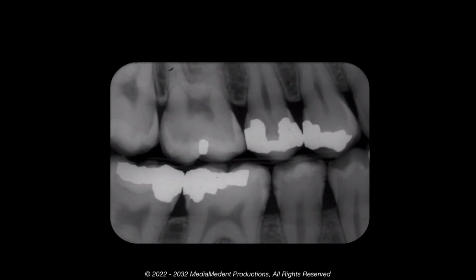As the proximal lesion progresses in enamel, it assumes a triangular shape. The apex of the triangle is directed toward the dentino-enamel junction. The arrow in this radiograph points to a lesion at this stage on the distal of the mandibular second premolar. There is also a lesion that has progressed to this stage on the mesial of the first molar, and an early carious lesion on the mesial of the maxillary right first molar.